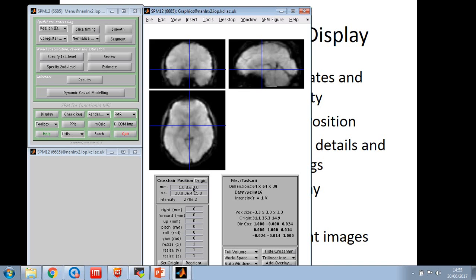So in my case, I'm doing 1, 4, and 0. Oop, oop. So I'm going to just do a slight adjustment. Select reorient, sorry, set in origin. And now click reorient. Now this is the important part.